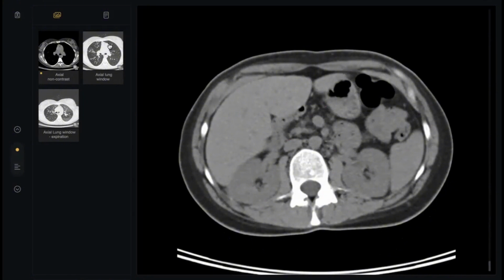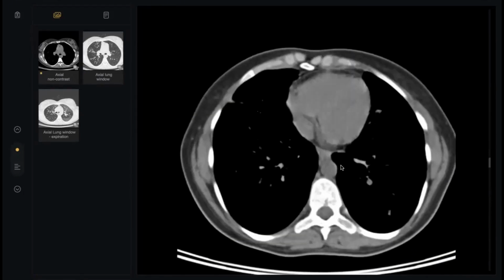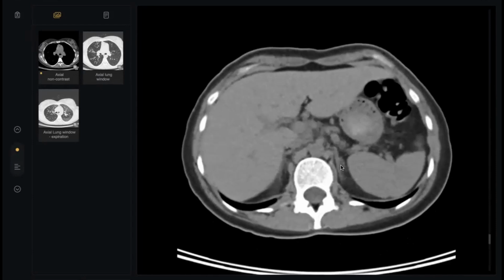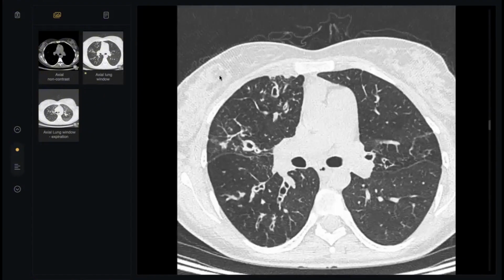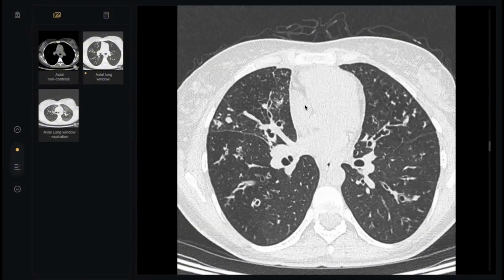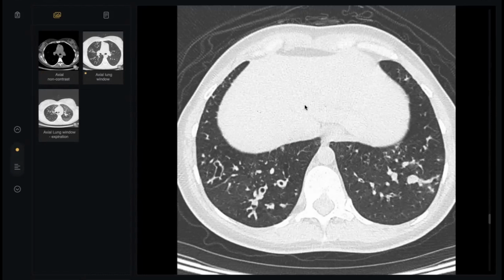That is why I start with the abdomen, because I am a very kind examiner. Other examiners will give you only the abdomen, and you must pick up on this. If you see fatty replacement in a young patient, you must ask for the chest. You will see bronchiectatic changes, predominantly apical, and at this moment you can make a diagnosis of cystic fibrosis.